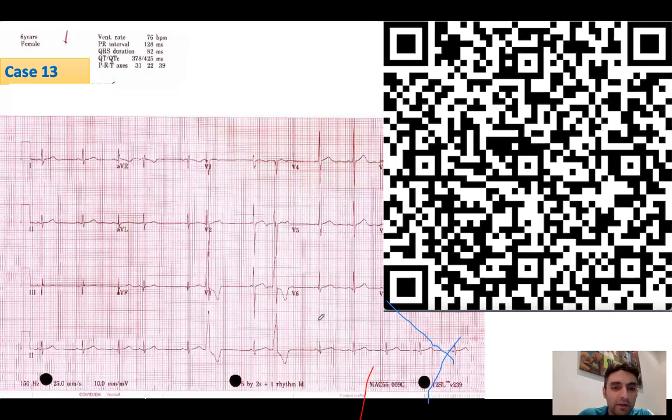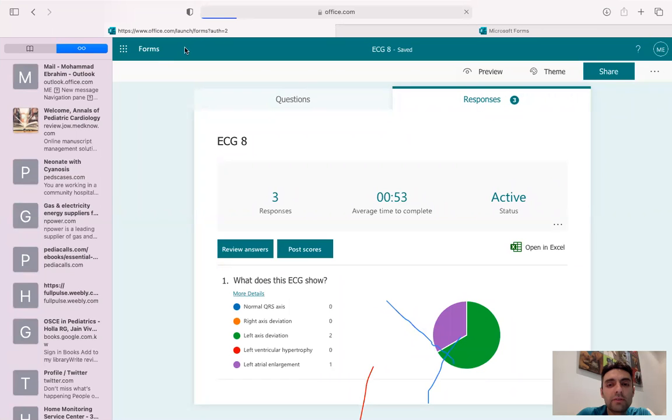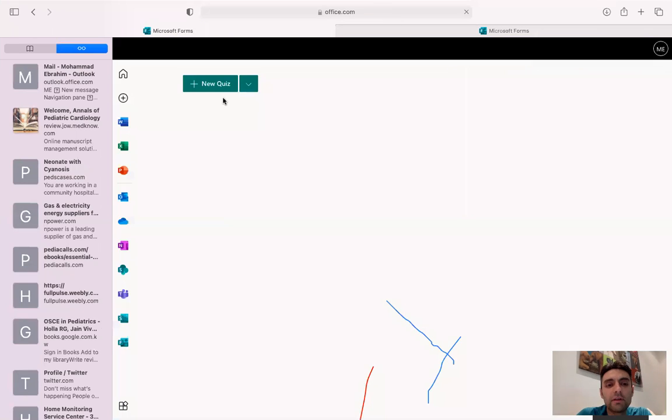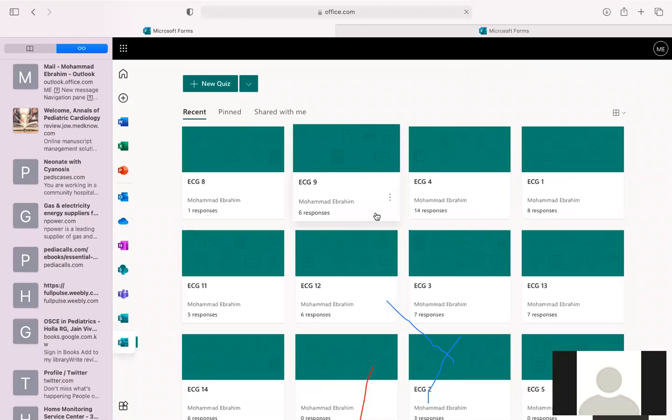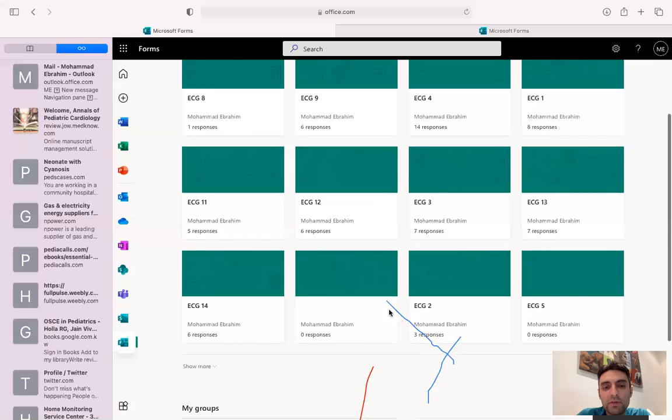Okay, easy, right? Of course there are extra beats. Ventricular. They are wide, not preceded by a P wave, so they are ventricular beats.